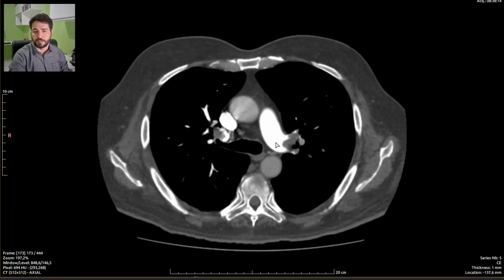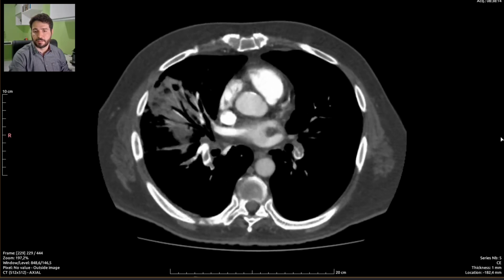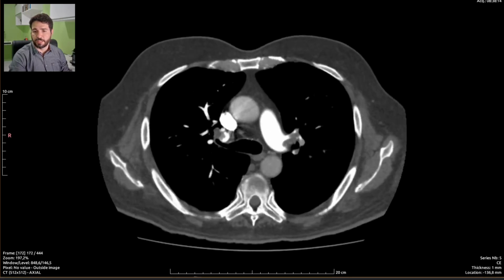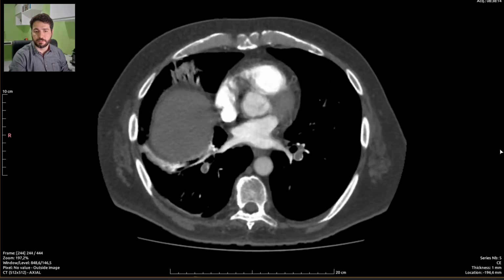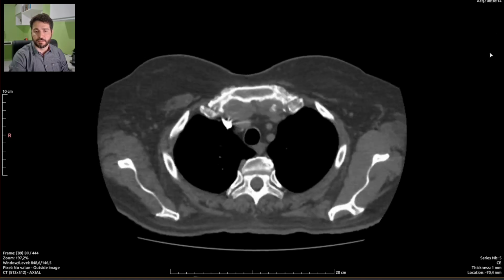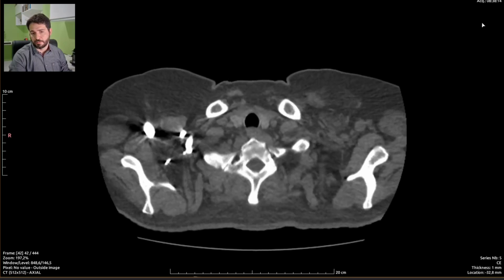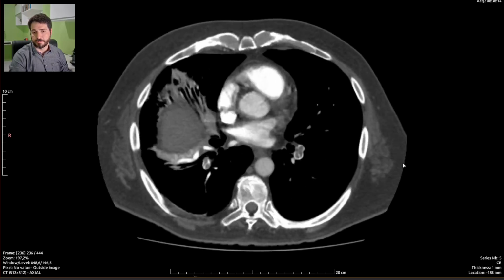See, this is a filling defect, an irregular acute filling defect all over the arterial circulation, starting off in the main pulmonary arteries, both left and right, and going into the lobar, segmentar, and subsegmentar or segmentary branches, primary, secondary, tertiary, and so on and so forth. Segments, branches of those arteries.